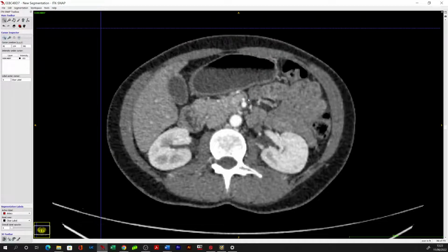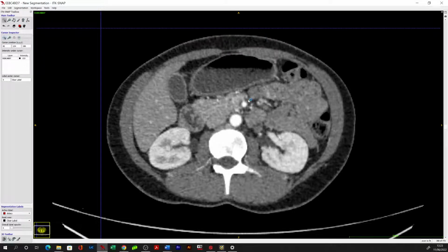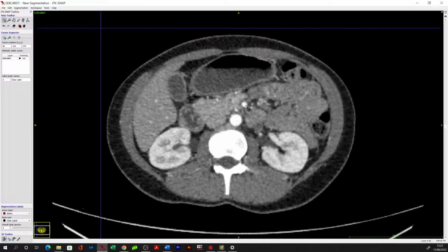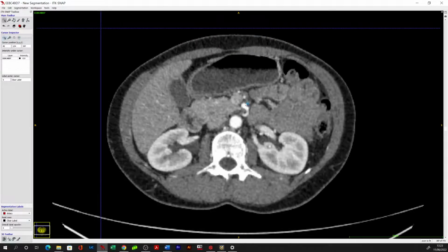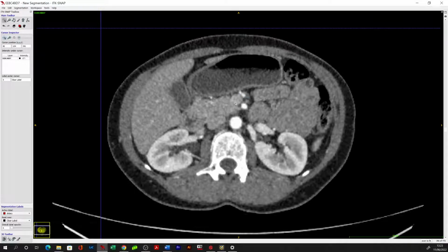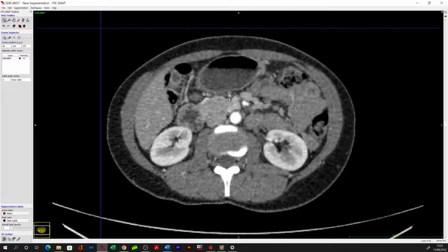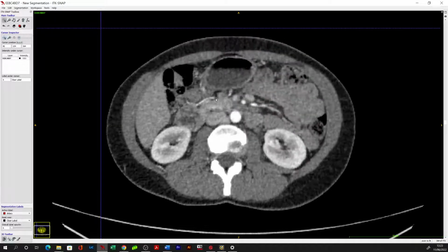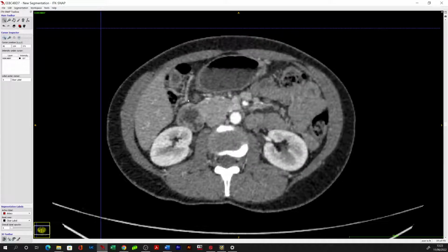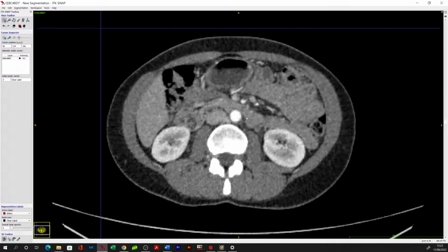So I think there's probably a little proximal branch coming off here, which you can just about make out, which is going to pass towards the left colon. But the main vessel here is coursing forward, passing over the SMV, and then we can follow this as it courses up towards the hepatic flexure and round. So that would be the typical configuration.